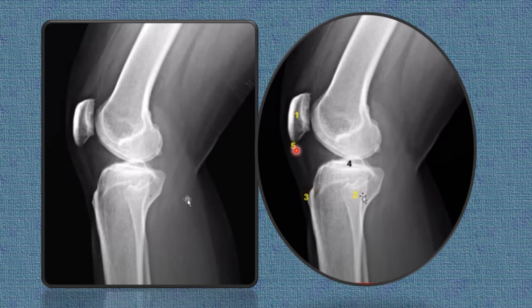And what is this line? Patellar ligament. One end is attached to the apex of the patella. The second end is attached to the tibial tuberosity. Right? So these are the apophyses. They give attachment to the important ligaments and tendons. So again, this is the patellar ligament.